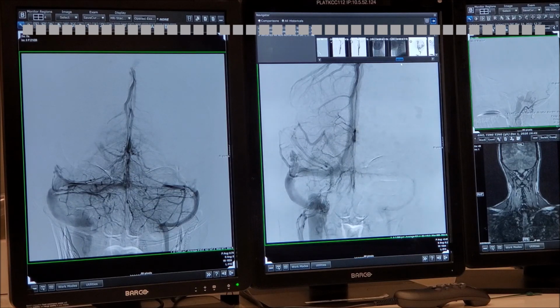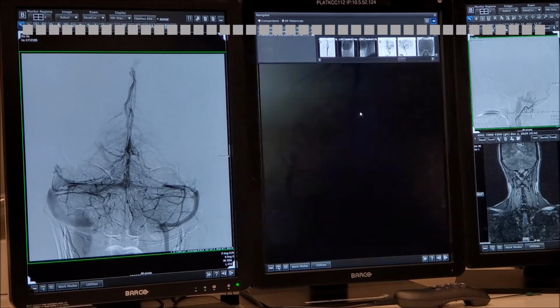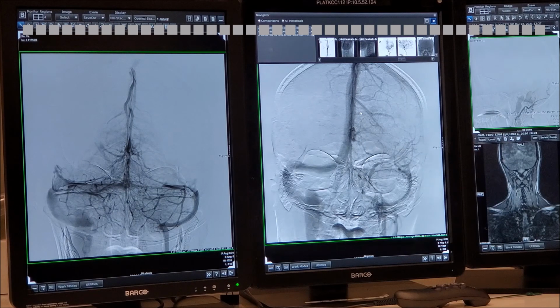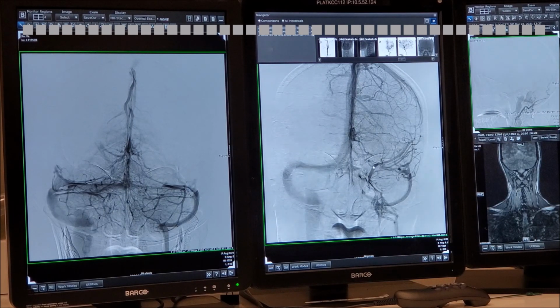So one thing I don't understand. If you have thrombosis in the sinuses... No, I don't see any thrombosis. No, you said it could be a precursor. And by the way, this is developmental. This is how this patient was born. So you mentioned that if there is thrombosis in the sinuses, that can lead to... The pathophysiology of the dural fistula is a pathological recanalization of a thrombosed sinus. Okay. Now, who was there first, the chicken or the egg? We don't see any evidence of thrombosis here.